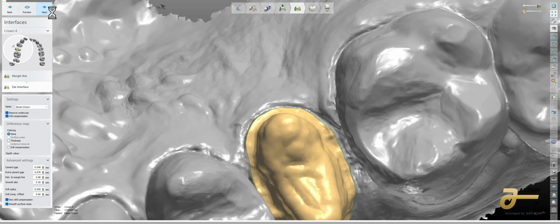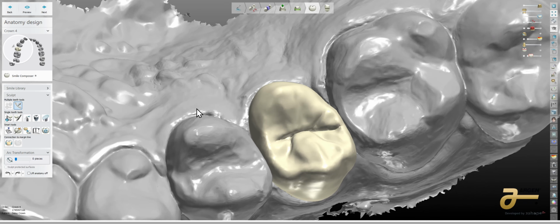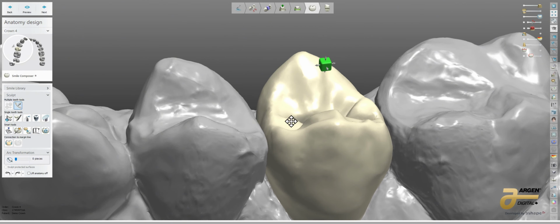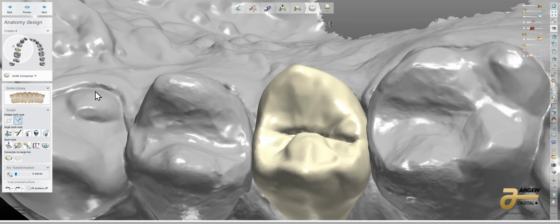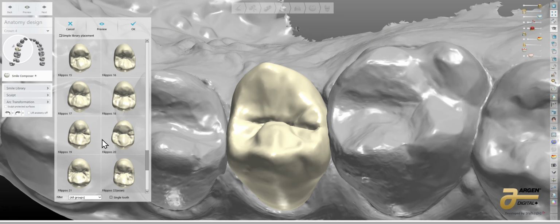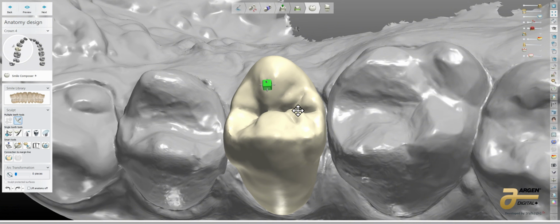All right. So now the fun part, most of this time we are going to bring a crown in position here. This was a case that was already proposed here. I undid all the clicks. Let's go ahead and remove this, but let's go ahead and just click any other smile library here just to be on the fun side here. And let's go ahead and just, I'll choose this one real quick. And we'll preview this and we'll bring it in and I'll say okay.